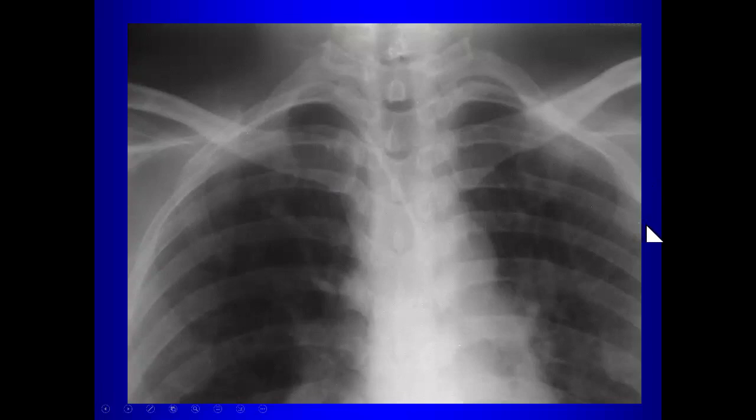Now, when it looks like a vascular catheter is in an abnormal position, the first thing you want to do is check blood return. If there's no blood return, it may be outside of the vessel, sitting within the soft tissues or within the mediastinum. But this catheter had good blood return, so where is that catheter? Well, notice it's headed towards this guy. What is this guy? Aortic knob. That's the aorta.